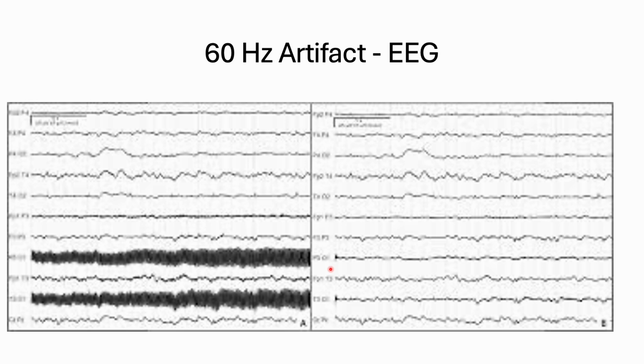So whenever the patient is laying on a charger, or especially a heated blanket, those are the worst. That's what it looks like. That is electrical interference with your signals, and that electrical signal is so great that it certainly overpowers it.